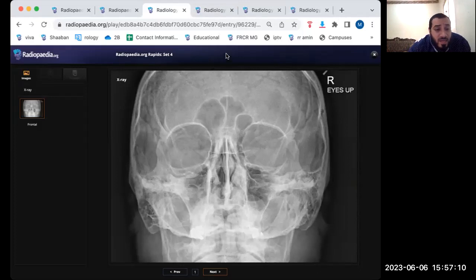No, the fracture is a very lucent line like that. The cortex should be disrupted. Sometimes there is soft tissue swelling, and you have both views. You should look for the fracture in both views. You should train your eyes to get used to the difference between the fracture and the vascular lines or trabeculae.